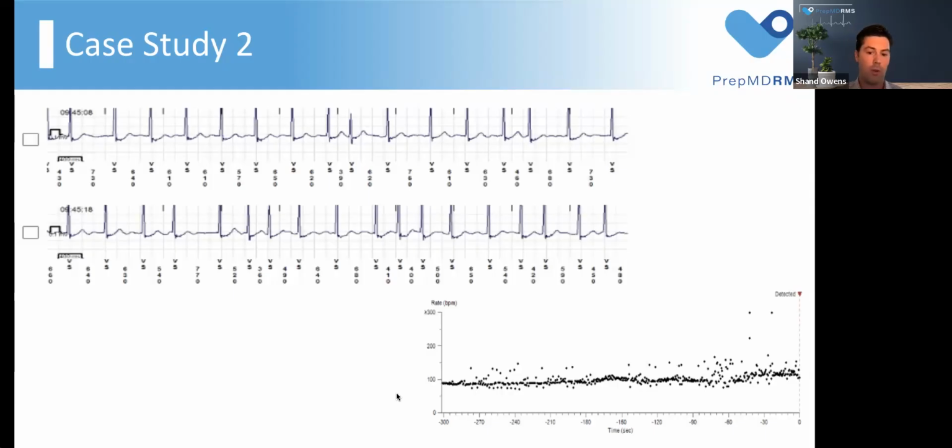And then if you look at the strip that's included with this plot graph, in the first few beats, we can pick out something that looks like a discernible P wave. Right after that T wave, that second peak that we see, we could think that is a P wave. But you really don't know until you use that gain tool.